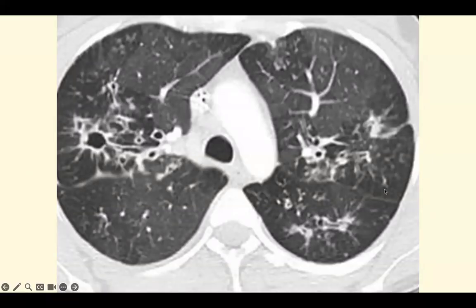In the mosaic attenuation session, we will talk about mosaic attenuation and mention its reasons in cases of bronchiolitis. But at least here we know this is mosaic attenuation that can occur in cases of bronchiolitis due to obliteration of the bronchioles. So it will cause regional mosaic attenuation, low attenuation of the lung parenchyma in a lobular appearance.